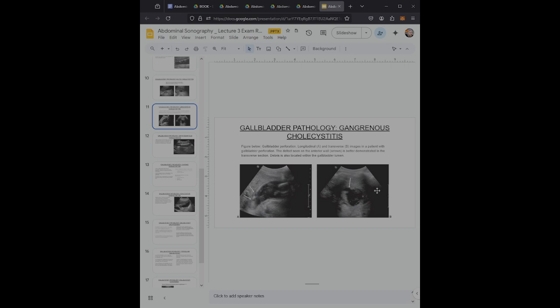So clinically, the patient does not always demonstrate a positive Murphy sign. And one of the differentials of this is empyema of the gallbladder, or suppurative cholecystitis, in which the gallbladder is filled with purulent material, such as pus. Although it may be difficult to diagnose sonographically, chronic infection of the gallbladder may also result in xanthogranulomatous cholecystitis, which is characterized by asymmetrical gallbladder wall thickening.